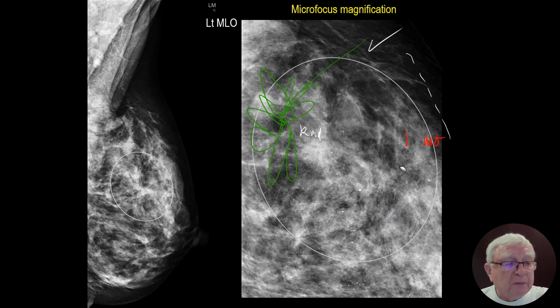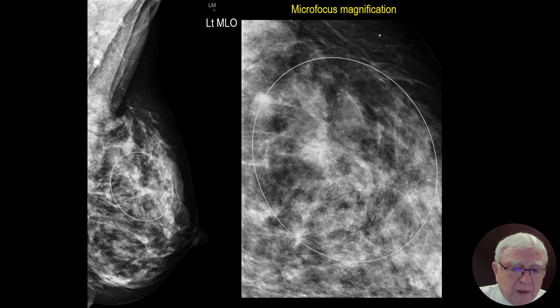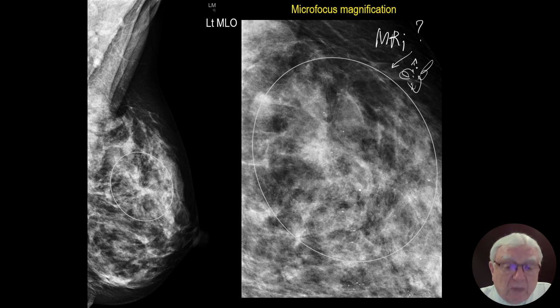Well, what would help you? Well, something is in our toolbox. Do you think MR would help you? Well, think it over 5 times before you think you get help from MR in radial scar. Because there are the fresh radial scars which increase metabolism while it produces the side branches, then it might be kind of positive. But if it's an old one with a big fibroelastic core, that is not going to help you.